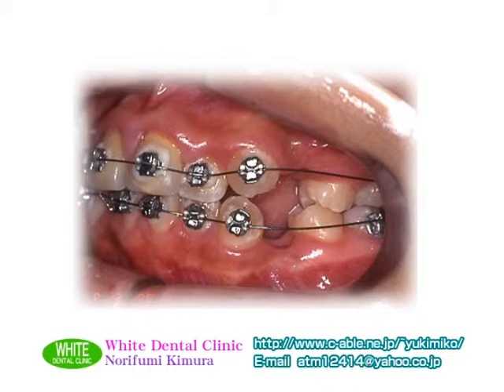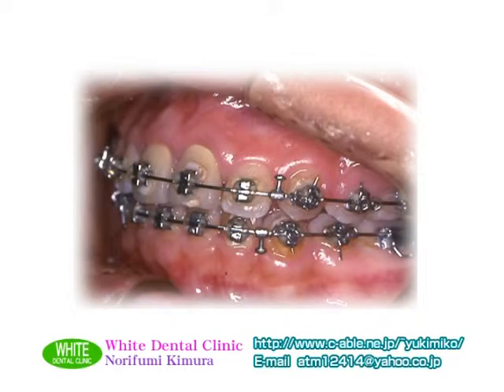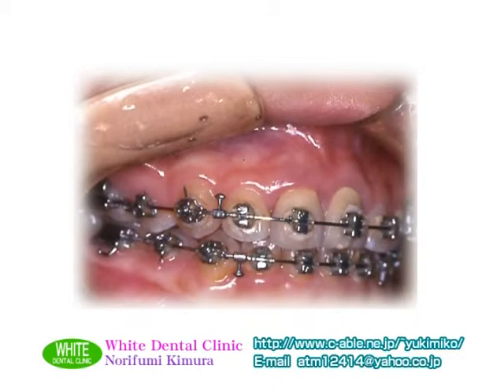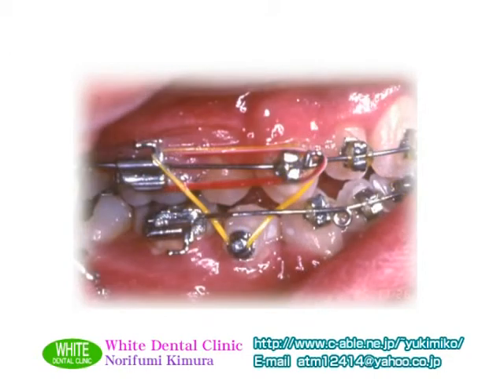One of the various causes preventing the premolar from attaining normal occlusion through orthodontic treatment seems to be the vague position of the buccal tube on the first molar surface. Consequently, successful set of the bracket position for premolars requires good experience and considerable skill. An apparatus that allows for correcting the vague position of the buccal tube is also needed in order to obtain reliable results. The slide type bracket has been designed to resolve these problems.